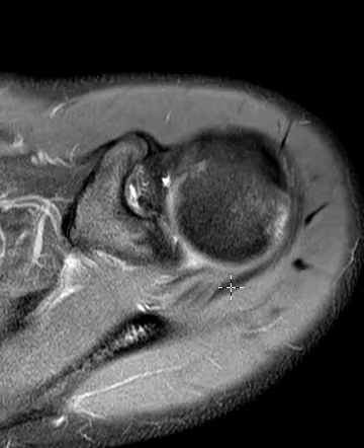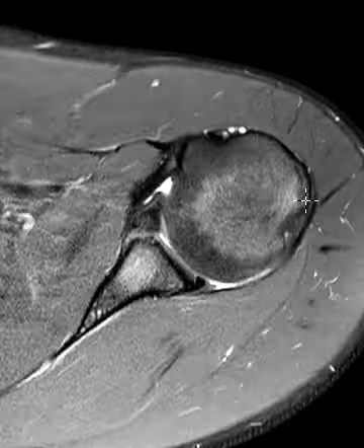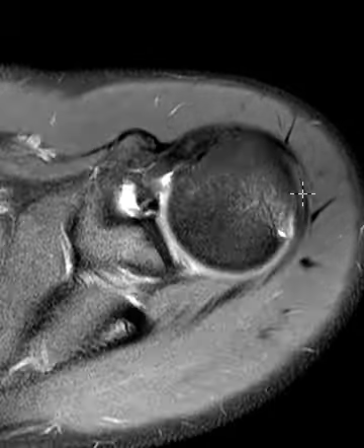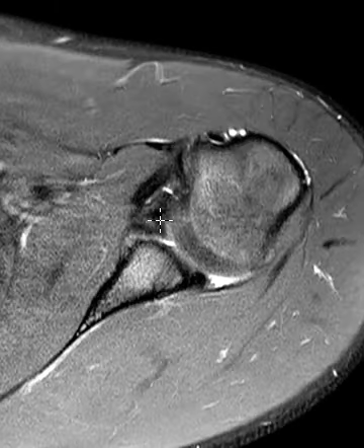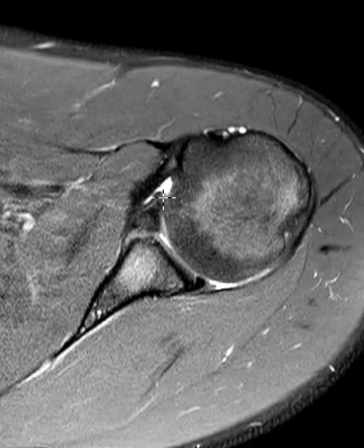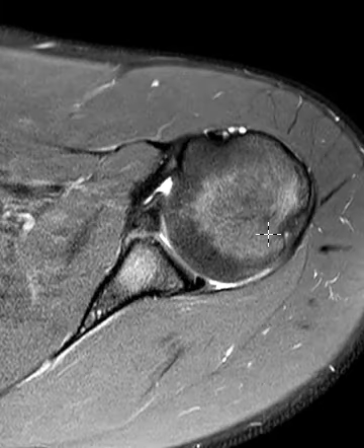So in the end, we have a fibro-osseous Bankart lesion that is chronic with an acute bone contusion related to a Hill-Sachs impaction injury. And if this were just the labrum torn in the joint capsule, we would call it a fibrous Bankart lesion. But since the bone is also involved, this big bone fragment, we call it a fibro-osseous Bankart lesion.